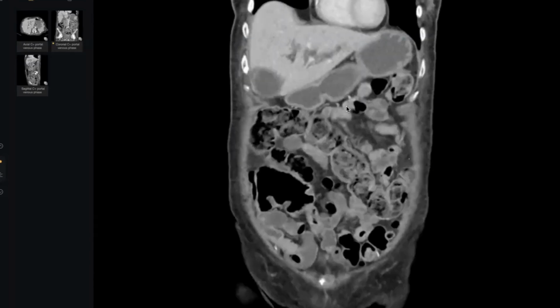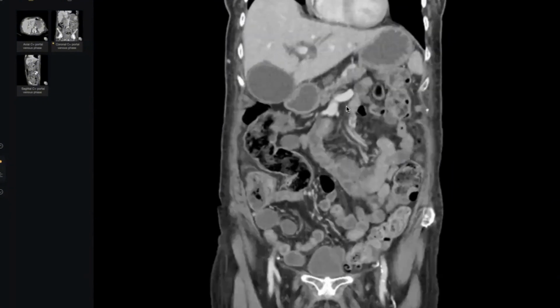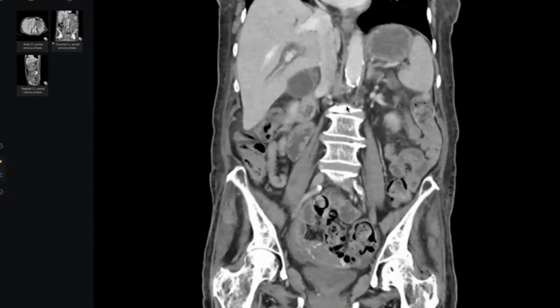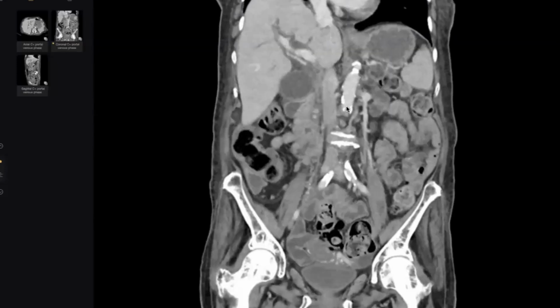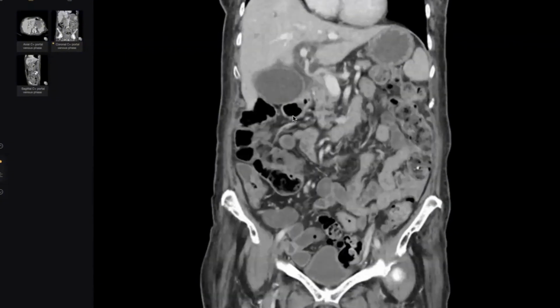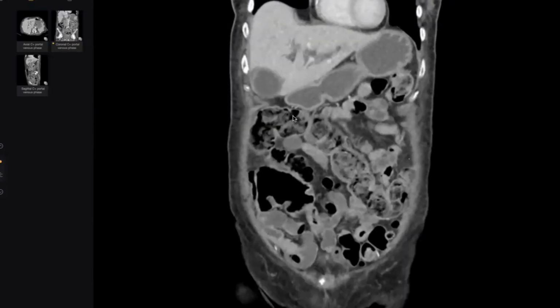This patient has a very distended gallbladder, so I would refer my findings to the referring clinician. The patient might need cholecystostomy. When you tell the examiner something, be sure it will make a resonance in his mind. The patient has gallbladder stones and ascending cholangitis. Do you remember the examiner about the markedly distended gallbladder? So you must exclude something in the gallbladder. What must you exclude?